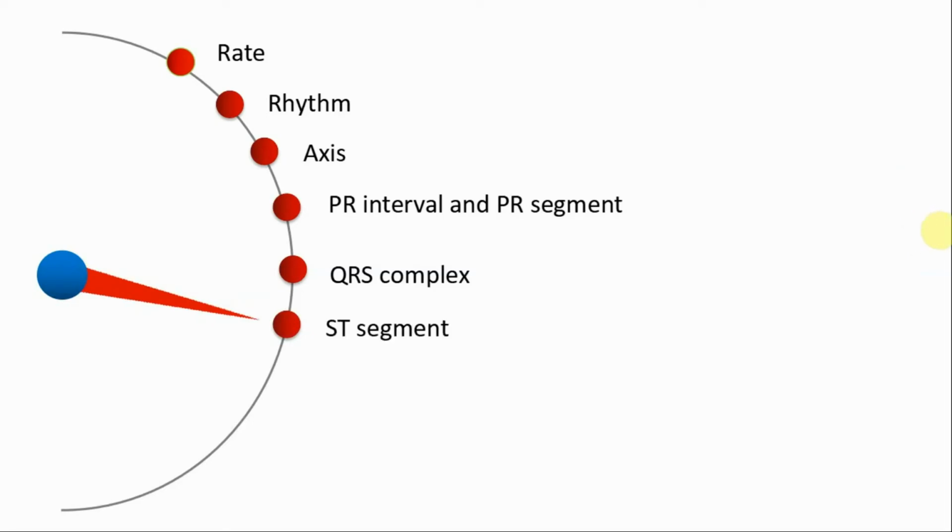The ST segment is important because if the patient has an ST segment myocardial infarction, or a STEMI, they can have ST elevation, and I have one 12 lead ECG with ST elevation and second degree heart block. So please don't forget to look at the ST segment even if you are focused on the PR interval, because this is a second degree heart block.